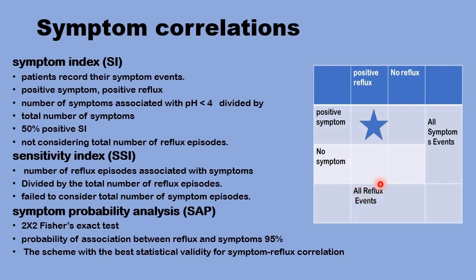And again, that's another way of measuring how much of a correlation there is between the patient's monitoring and the patient's symptoms.